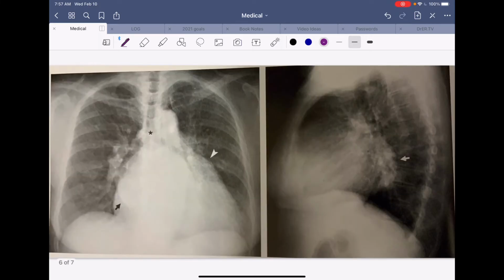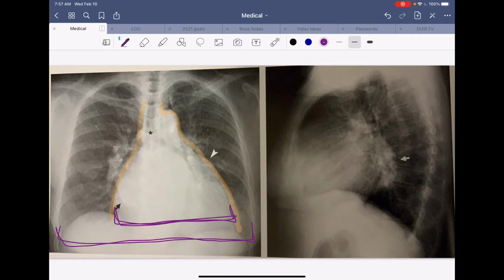Now let's look at this other x-ray. This x-ray is clearly abnormal compared to the ones we've seen before. Immediately you can see the major finding is the heart. It's very enlarged. Now remember, we talk about the cardiothoracic ratio. That means the cardiac size relative to the thoracic size should be less than 50%. In this case, it's more than 60% potentially. This particular patient is a patient with rheumatic heart disease. That means they have mitral and aortic stenosis from chronic changes from the rheumatic heart disease.